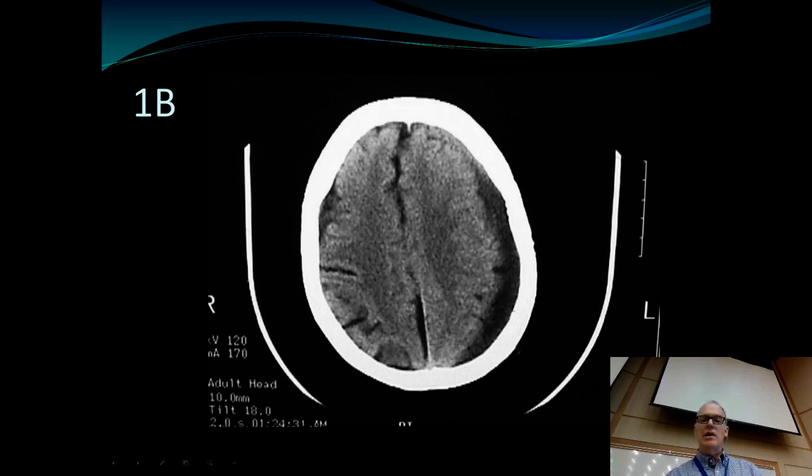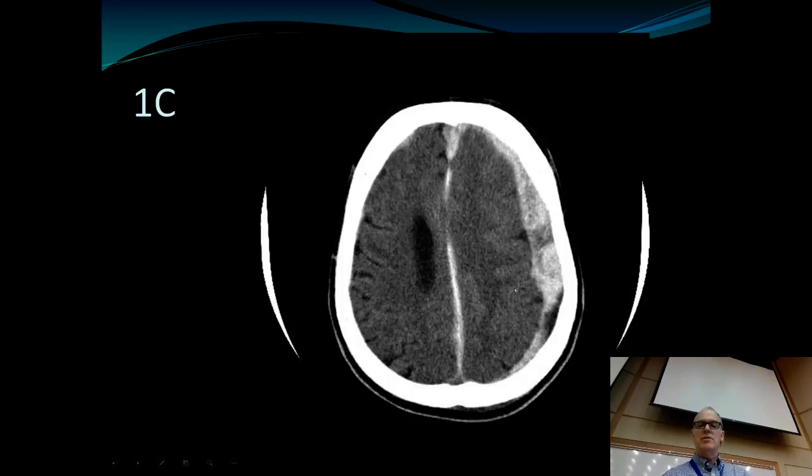Okay, and if we contrast, this is what a subdural looks like. Again, notice it's layering out along the entire surface of the brain. Subdural hematomas are much more likely in the elderly, and this is a venous hemorrhage, not arterial. Subdural hematomas, it's shearing of bridging veins. The other thing we could say about this is it's all dark, and so what that tells us is this has been there for a while. So acute blood looks bright on a CT, but after days and weeks, the brightness turns into just a dark fluid-filled, like the CSF kind of intensity.